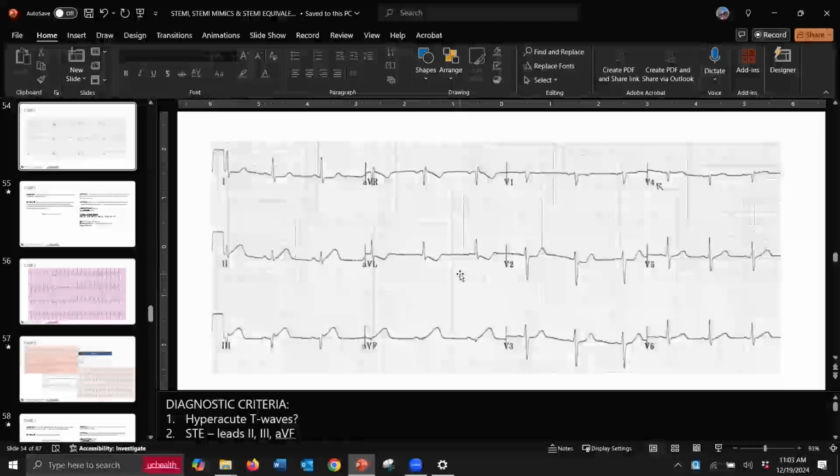Well, maybe not. That looks like wandering baseline in lead 1. See how high the T to P is compared to the T to P in the next. I'd say 2's your best bet. I wouldn't call the other 2. 2 or aVF, or 3's your best bet, rather.